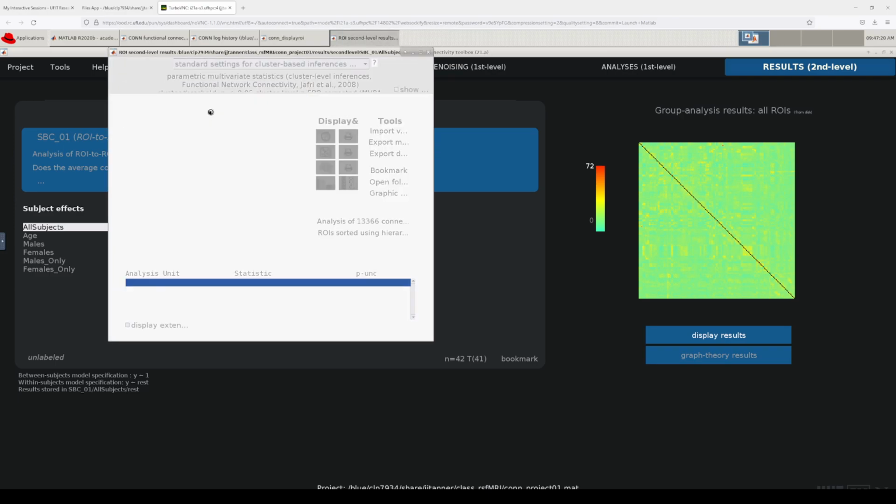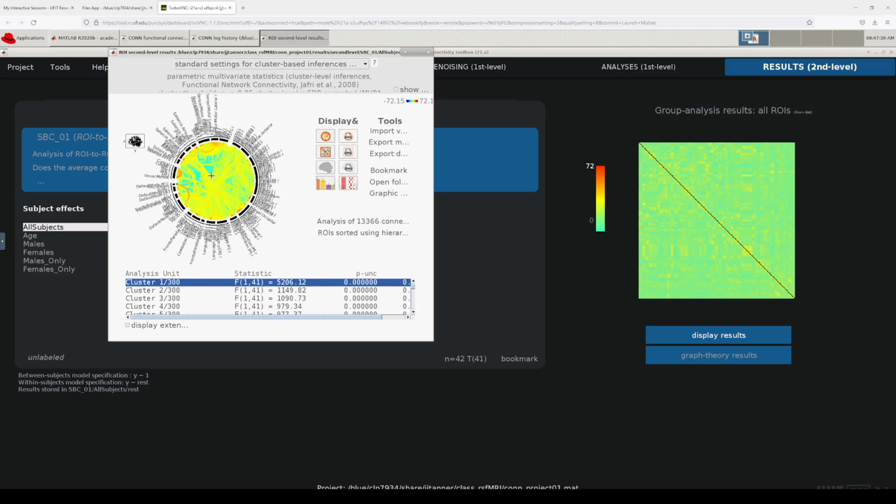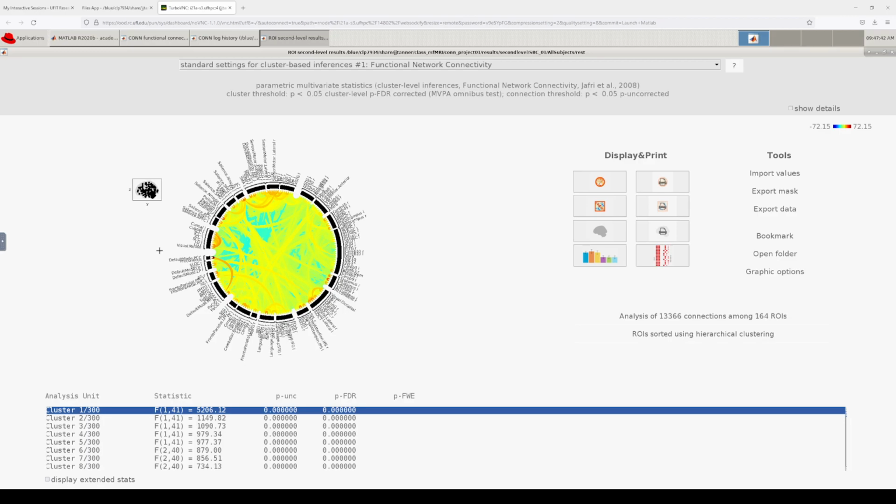We'll have a lot of connectivity showing up because we're looking at 13,000 connections, and this is just intrinsic connections. I would make the screen a little bit larger if possible. Take a screenshot or maybe do a subset of connections, and we'll call it good, and that'll be it for the assignment.